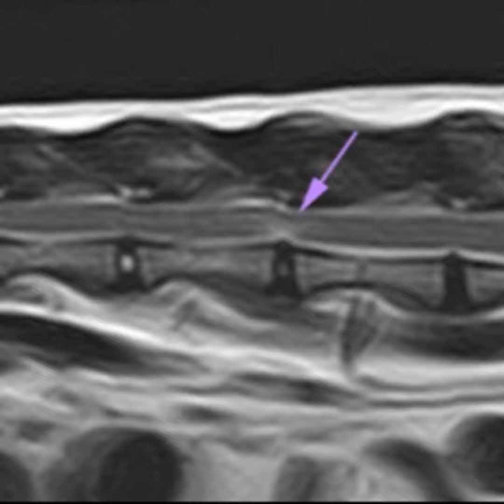So for the number of disc herniations, we found a correlation with both onset and type of disc herniation. So the single intervertebral disc herniation was associated with both the diagnosis of the acute non-compressive nucleus pulposus extrusion and the peracute onset of clinical signs. In contrast, cats with multiple intervertebral disc herniations were statistically more affected by protrusion.